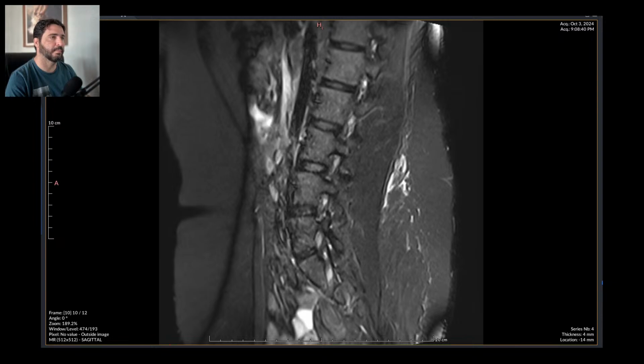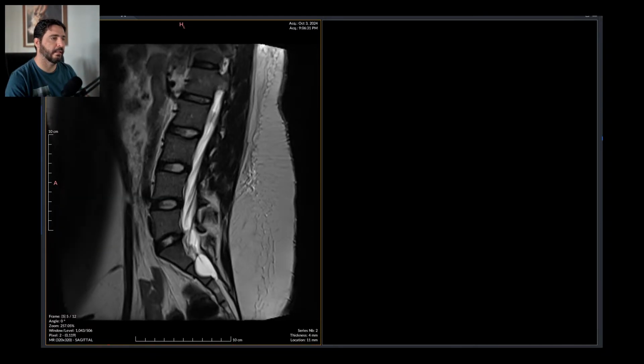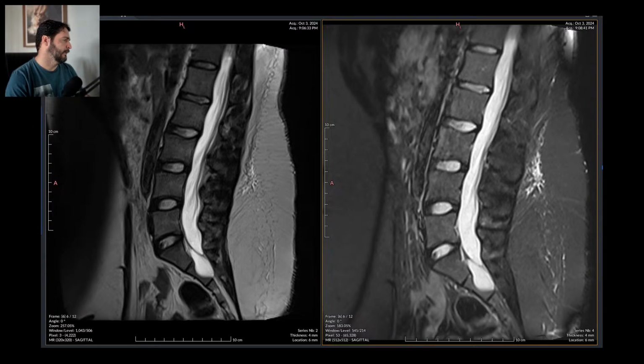So this is a lumbar spine. And I have seen a disease already. What about you guys? It says here, oh, I can't read because whoever wrote it wrote it in a way that it doesn't look like proper writing. So it's just impossible to figure out whatever is written in the exam request order. It says she has some kind of nerve root disease. It doesn't say on which side it is. They just say it is.